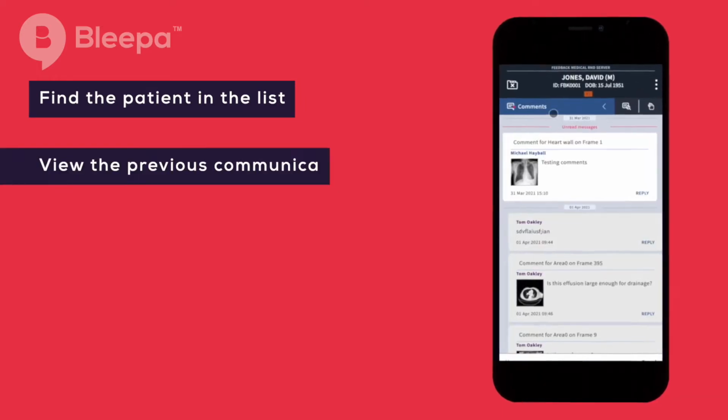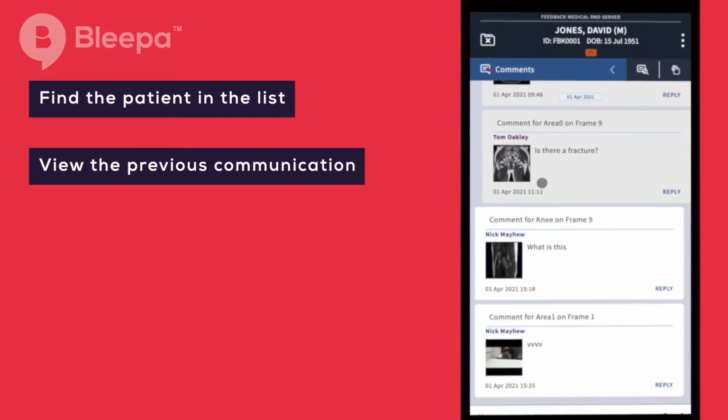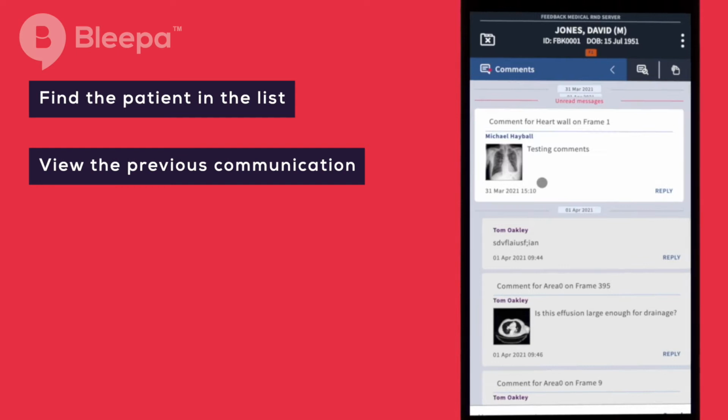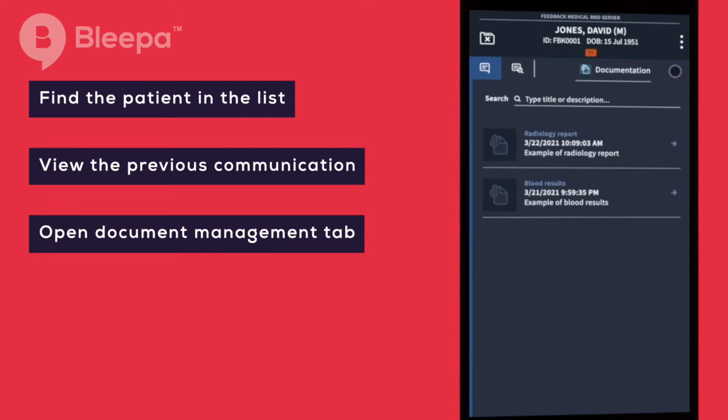Here you can see the chats that are going on around the patient, and we can then respond to our clinical colleagues. Here you can see the patient's available medical imaging, and here, as a third option tab, is the Document Management tab. If I click on this, you can see we have an available radiology report and blood results. Let's click on the blood results.